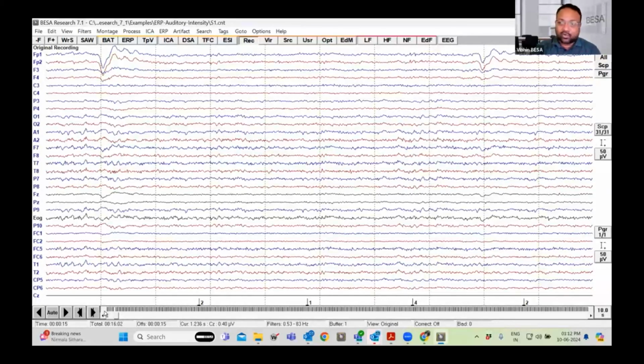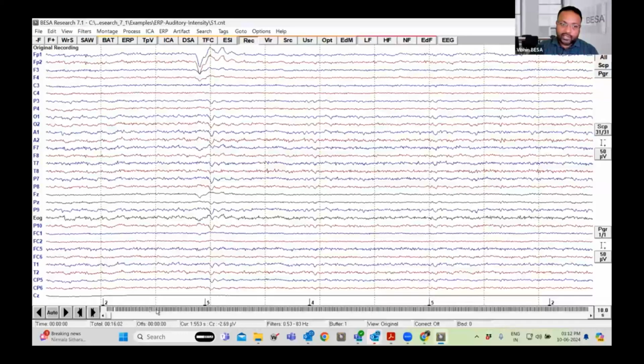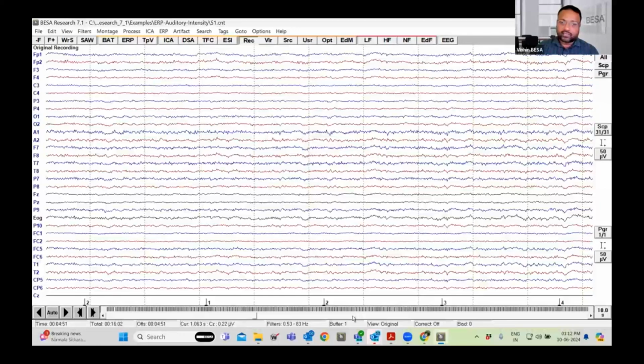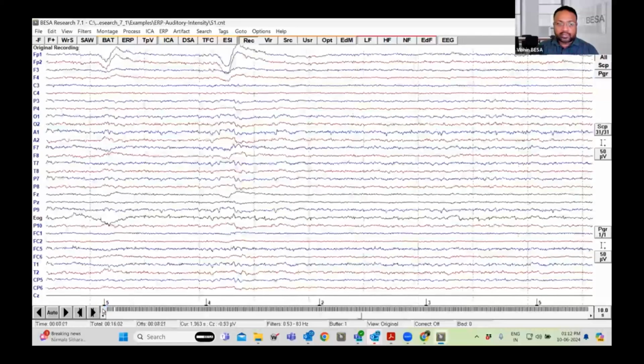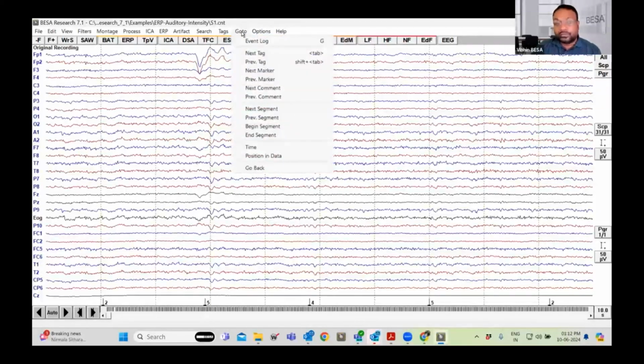Let me go more forward. As we said about navigation, you can also go directly to certain points just by clicking anywhere on this vertical tab. It just takes you to that required location. Again, you can get back to the original position by clicking here. Next, you can go to certain points or triggers. All you need to do is use this go to button, the third from the last in the upper section.